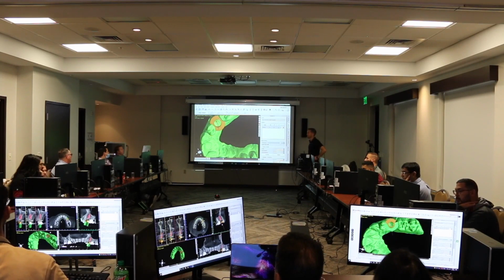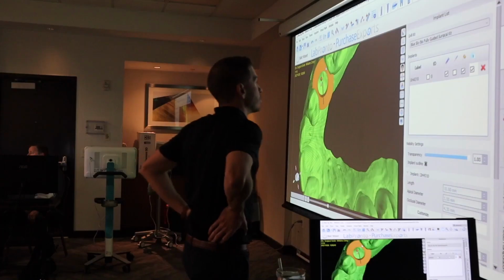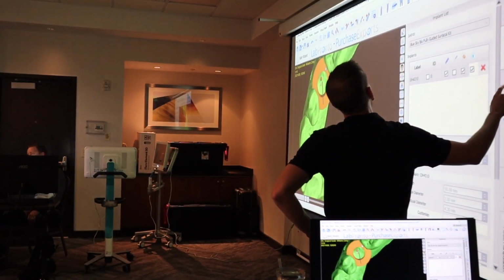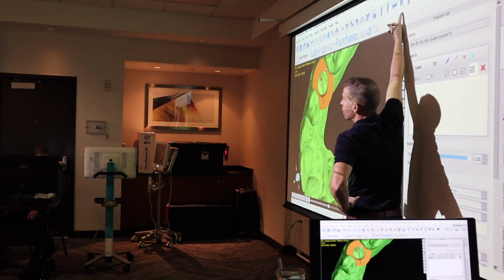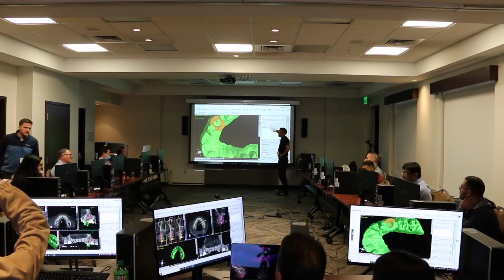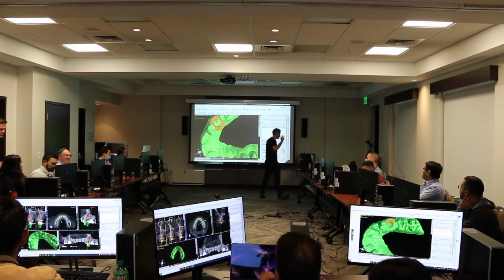How do you get rid of the tooth in there, Matt? The tooth? Yeah. He already put a tooth in. So you should have a toothless panel that you can click. Up here is a tooth too. If you click that, it'll turn on off all the teeth, right? Okay. That'll get rid of the teeth. So everyone should just be seeing a guide tube on their STL.